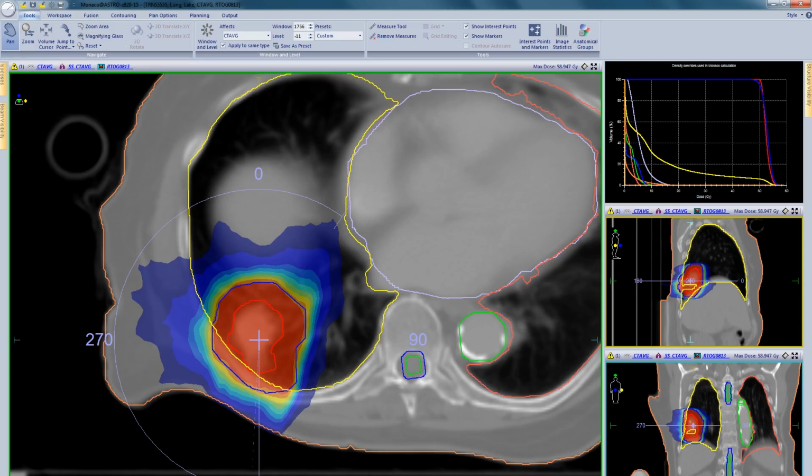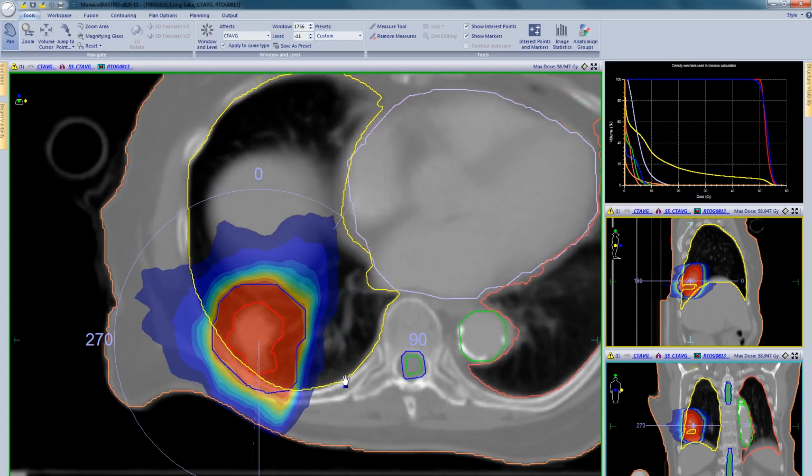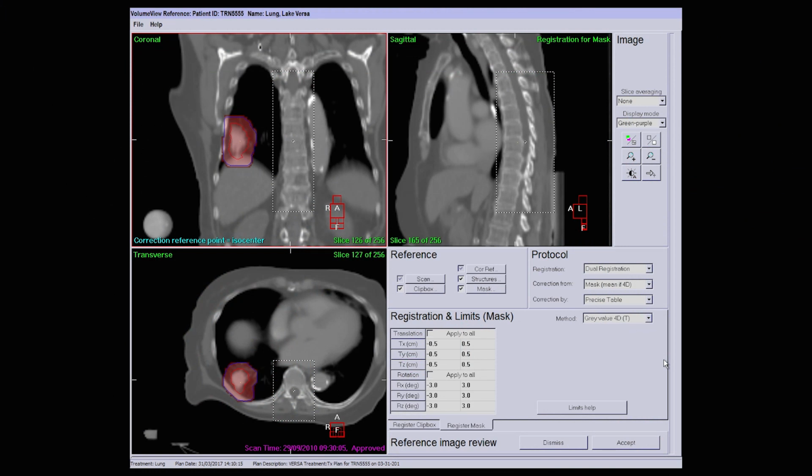How can accuracy be maintained for this plan during subsequent treatment delivery? How can you determine whether the relationship between the tumour and the critical structure has altered? Is the high dose prescription still being delivered to the tumour? And is the critical structure still within tolerance? The clip box and shaped region of interest have been defined. The limits have been input by the clinical team for both the target and the critical structure. If these limits are exceeded, the software will notify the user.